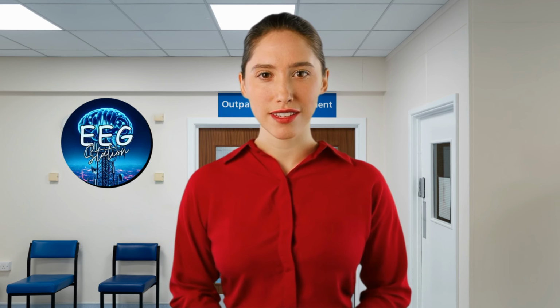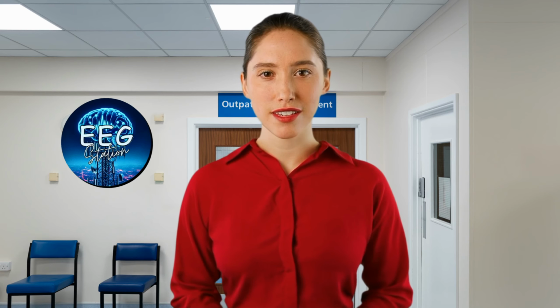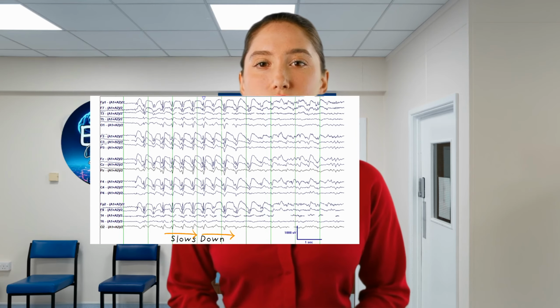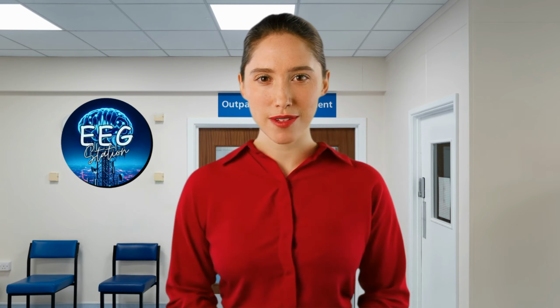Such spike and wave bursts often exhibit variance in the rhythmic frequency of the complexes. The frequency tends to begin at a faster rate and gently decreases in frequency as the burst continues. Say, for example, the burst initially fires at a rate of 3 Hz, but gradually decreases in frequency across time until the burst ends with a frequency of 2.5 Hz. We'll keep this in mind as we proceed.